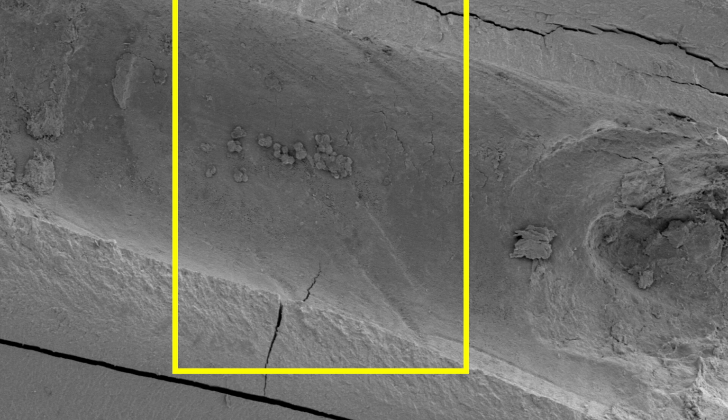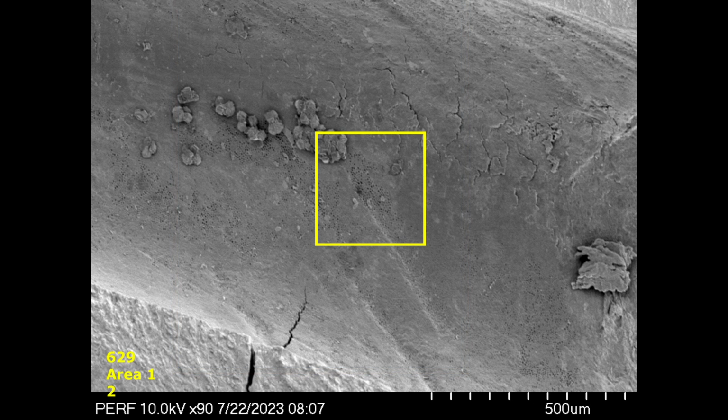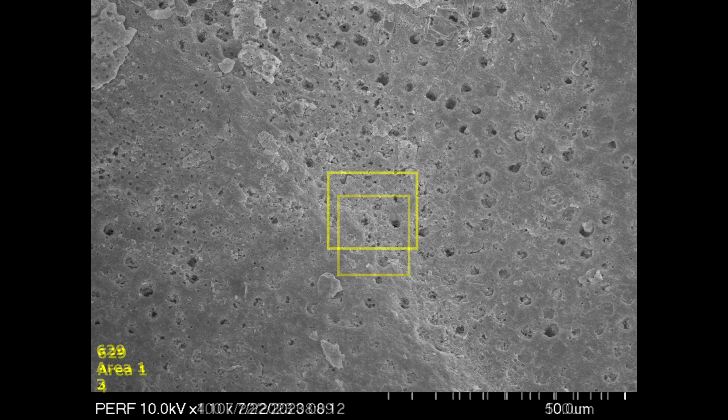Although most areas were coated with sealer, there were some areas where the naked dentinal wall could be observed. Area 1 is fairly typical when you see a very limited smear layer, no predentin to speak of, and only a slightly mineralized mineralization front.